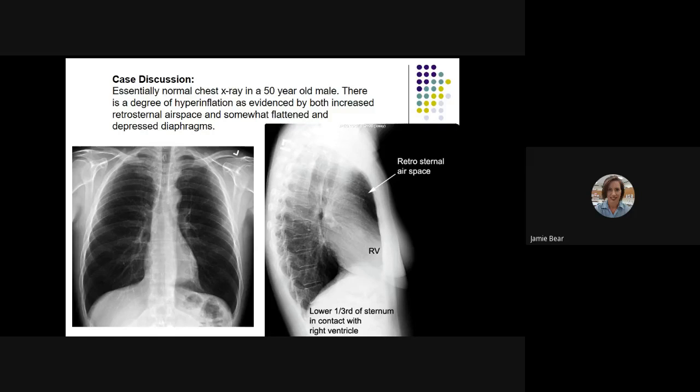So you guys, anytime you're seeing a trachea or the whole mediastinal cavity, sometimes you'll see the whole cavity shifted. When there's air outside of the lungs in the pleural space, that will shift the trachea away. So say if it's on the right side, it would push the trachea to the left. Same with a massive amount of fluid. So a large pleural effusion would do the same thing. It would push the trachea away.